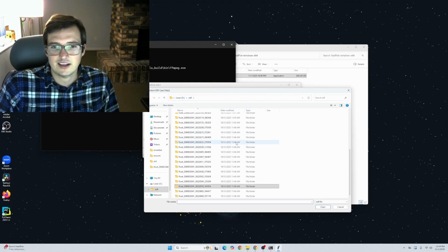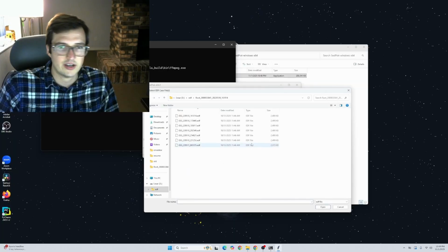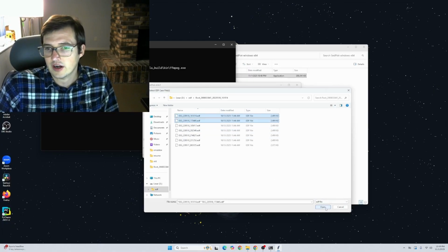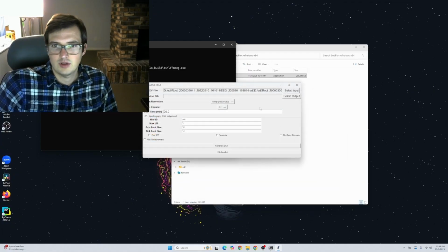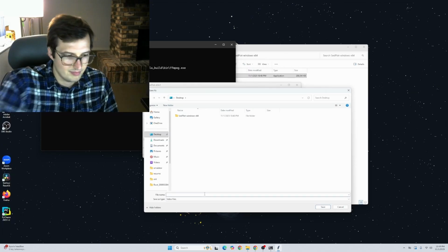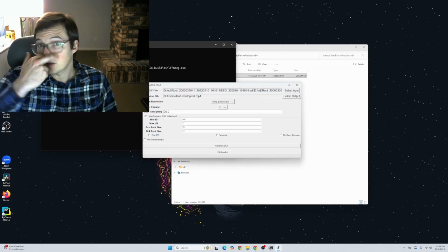So let's select some input data now. So I'm in my Lexar EDF directory, and I was playing around with this earlier, so I know this third directory has some interesting data. And let's say I want to generate a video of the first two case files in this directory. So I'm going to open it, and my output's just going to be out.mp4. Actually, let's save that to the desktop.